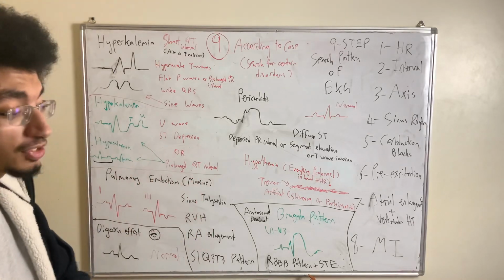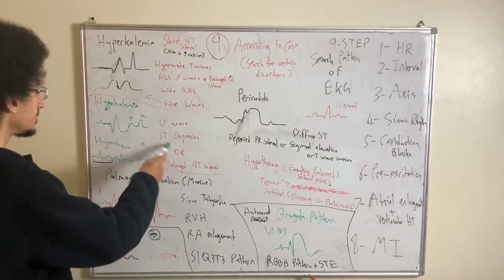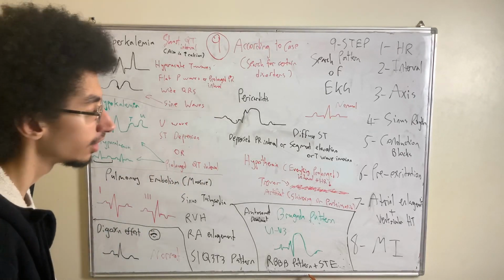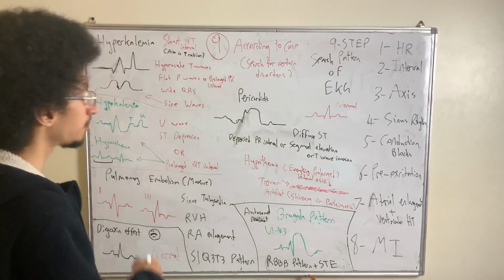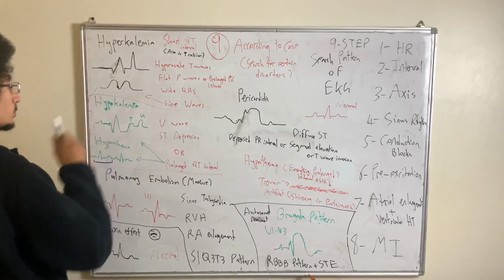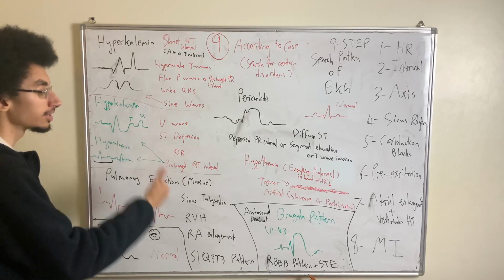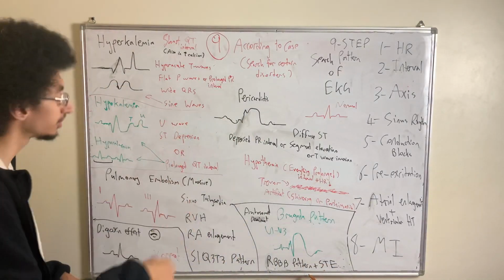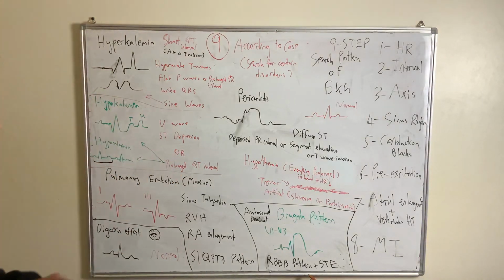So this is another very specific finding of hypokalemia: you may see the presence of a U wave accompanied with ST segment depression, and in severe cases, it can lead to prolonged QT interval, which therefore joins with hypocalcemia as one of the causes of prolonged QT interval. So hypocalcemia can cause prolonged QT interval. Hypokalemia can lead to ST segment depression, and the appearance of a wave that's greater in amplitude than the T wave and comes after the T wave, known as the U wave. You can have a U wave plus an ST segment depression plus a prolonged QT interval for hypokalemia.